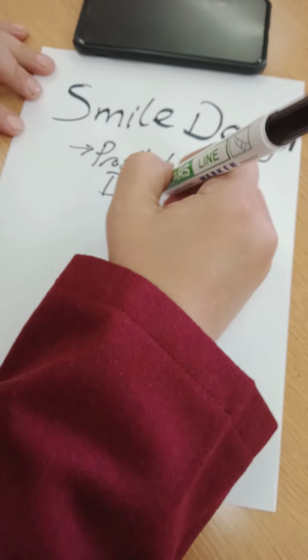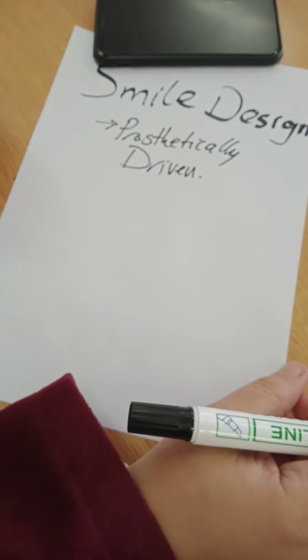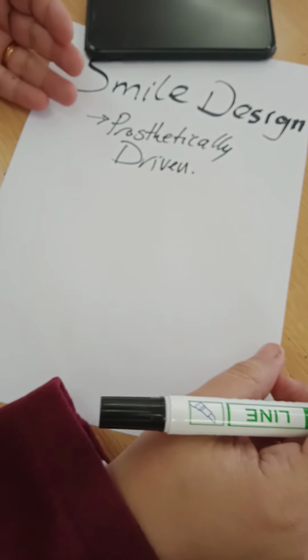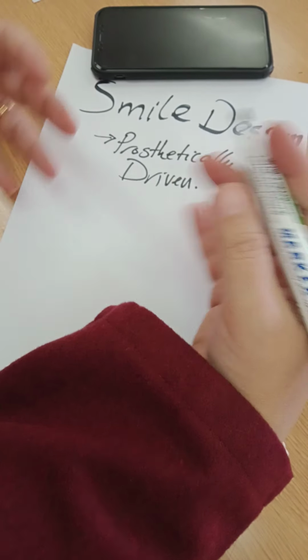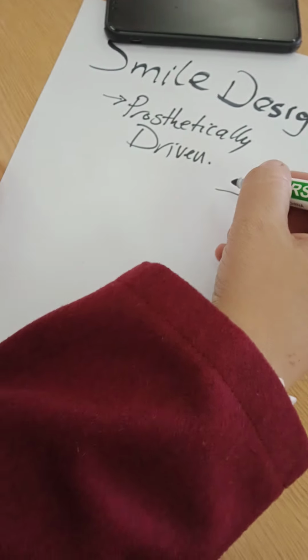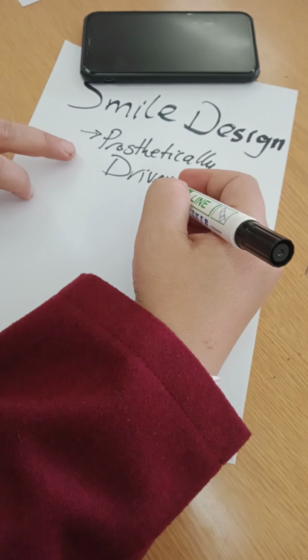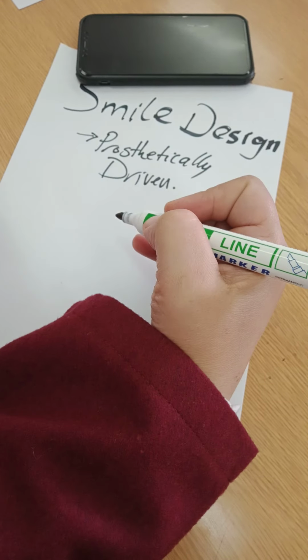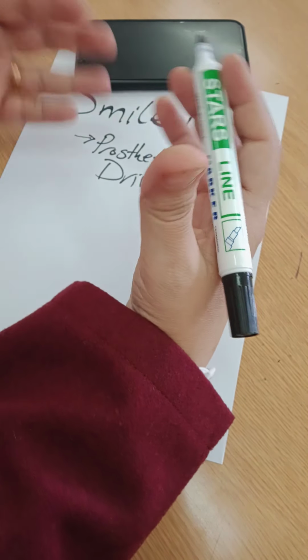Many times, the person who places the implant is not aware of the prosthetic treatment that will happen later on. So what will happen? They will open the gingiva, open the bone. Maybe they'll see the CBCT before, but they will place the implant in their ideal position in terms of bone volume and morphology, and they will not take into account where the position of the restoration is going to be. Prosthetically driven restorations or implants mean they are putting the implant in the favorable position for the prosthetic part, not for the bone part.